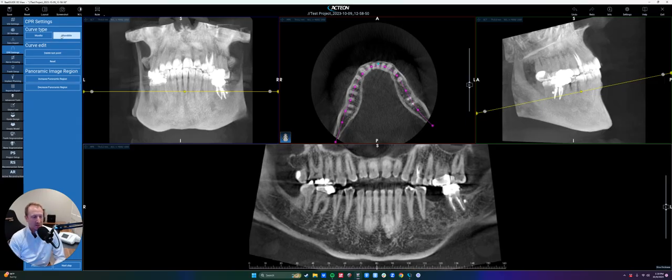Okay, so our next step is going to be the nerve mapping and the nerve drawing, and I'll showcase why doing the nerve mapping in this screen versus not, the difference between the two. So let's go to the nerve drawing panel now.